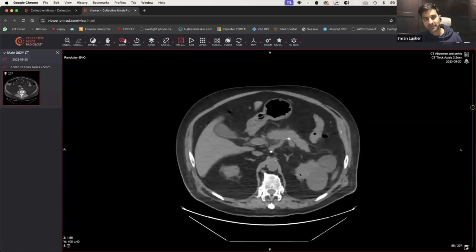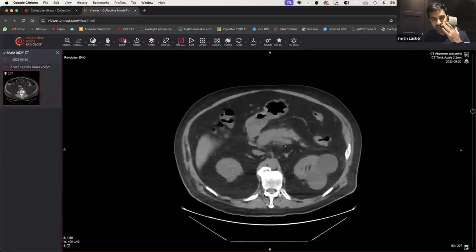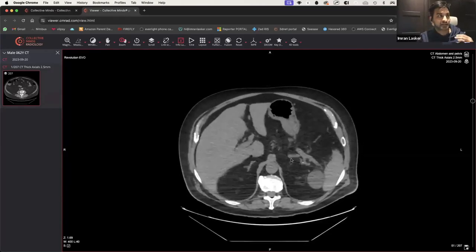One of the complications of pancreatitis is splenic vein thrombosis, because that's the splenic vein over here. And because it's so close to the pancreatitis, or to the action, that can result in a prothrombotic situation where you end up getting a thrombosis within that region. And over time, you can actually get splenic artery aneurysms as well. You can get collections over time.